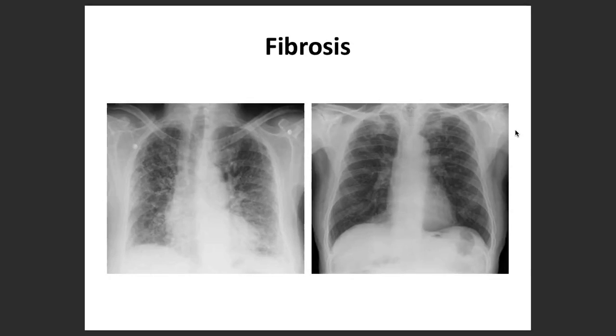The possible etiologies are respiratory failure, pulmonary hypertension, or even heart failure. So what do you notice over here? Someone has already said about all these things. Cardiac shadow is also dilated, sir. Cardiac chamber, good, good. And there is effusion in the left costophrenic angle. Mild effusion is also there. Wonderful, wonderful. The terminal bronchioles are fibrosed.